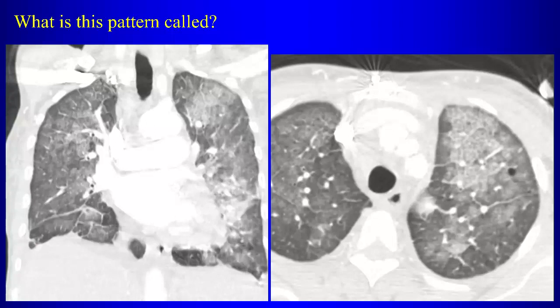You're just going to go with pulmonary hemorrhage on this too? We can. Let's not. That comes later in the course. Look, first of all, you're right in the sense that crazy paving can be associated with pulmonary hemorrhage. But the most common cause of crazy paving, if you see it in clinical practice, is what? What'd you say? Come on, spit it out.